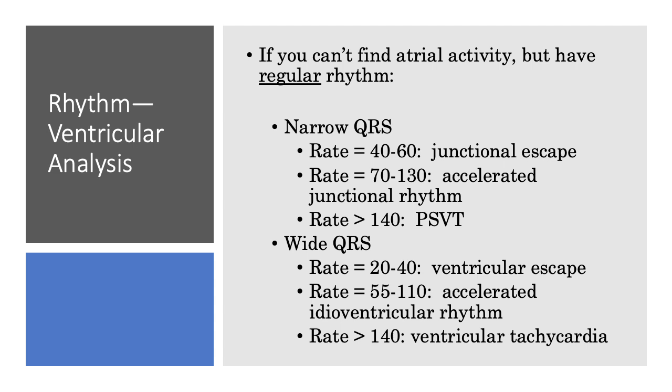We're not talking about criteria and trying to determine which type of PSVT is happening here, but just know that if the rate is greater than 140, it's probably a PSVT.